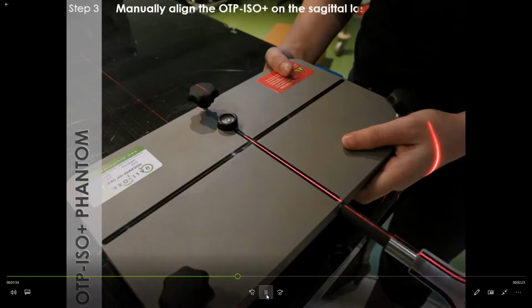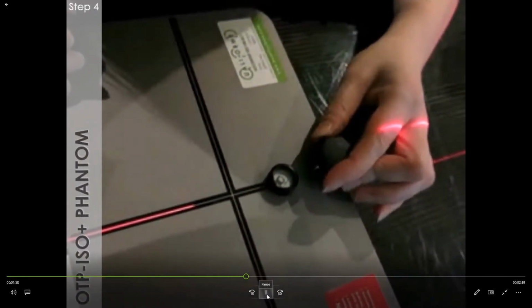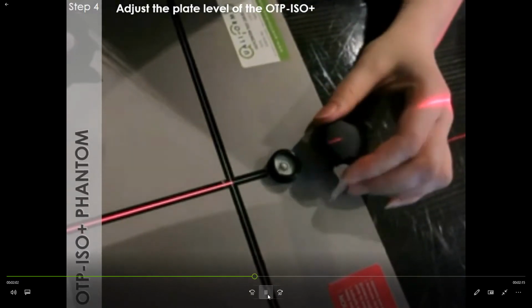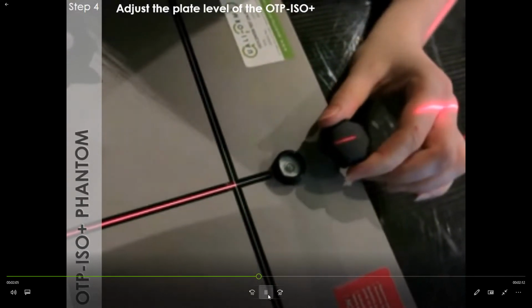Next, you will adjust the level. As you see, when you adjust the level, nothing changes with the sagittal line because the spirit level is on the sagittal line.